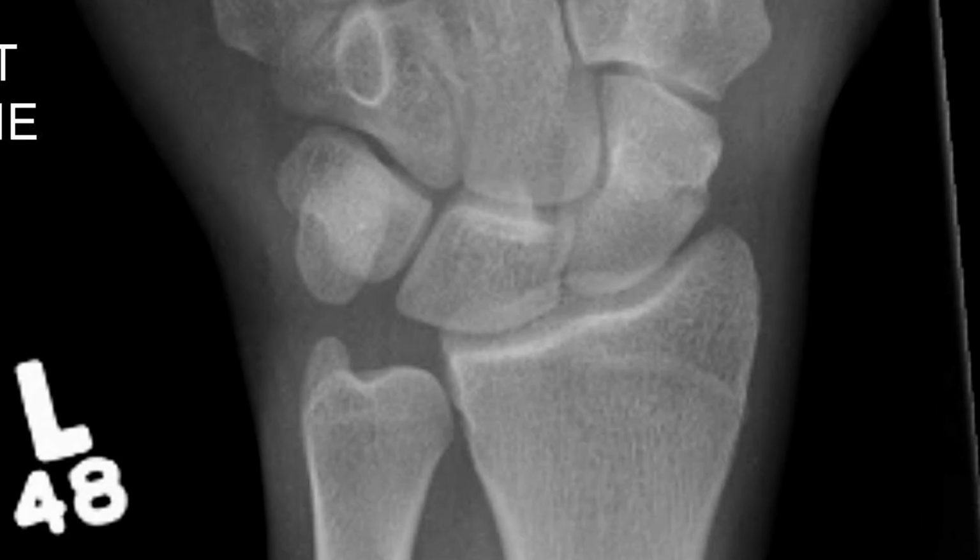You see a scaphoid fracture over there. Yeah, so if a scaphoid fracture is present, there will be tenderness on telescoping, tenderness at the anatomical snuffbox, and tenderness on the thenar eminence, and you put them in a scaphoid cast. If a fracture is not present and you get these clinical findings, you still put them in a scaphoid cast and get them to fracture clinic in 2 weeks' time when they will be x-rayed again.